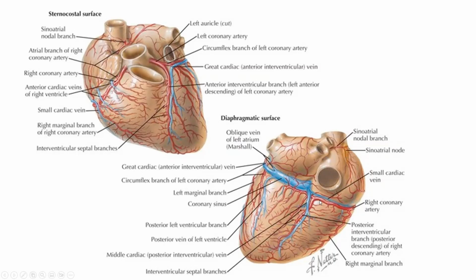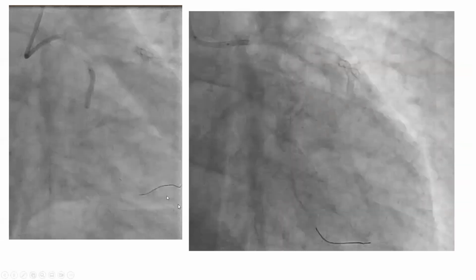You have a right coronary that only gives a PDA. You'll have a circumflex that gives all the PLBs. And an extreme of that will be the right coronary that is not dominant, that doesn't reach the crux, and the circumflex will give everything, PLBs and PDA. So they kind of meet in that zone. So you can imagine an extreme case, extremely rare, where the right coronary goes all the way up in the AV groove. It goes all the way up in the left AV groove, all the way till here. Unusual, but that's one rare possibility.